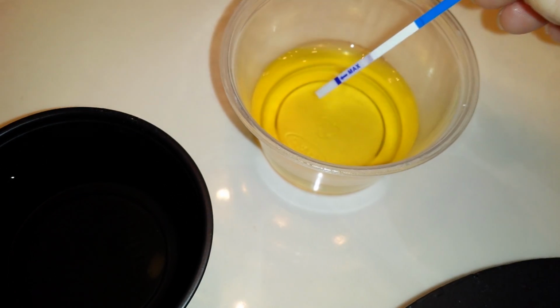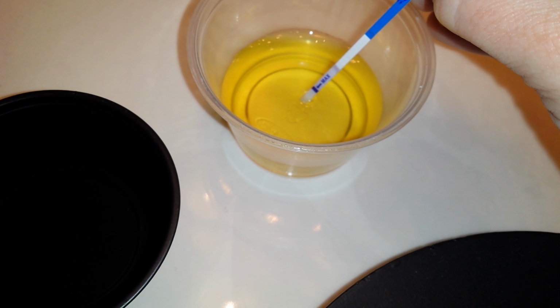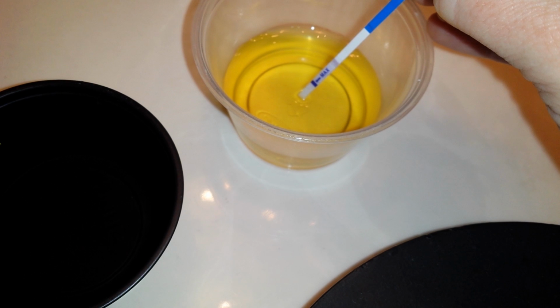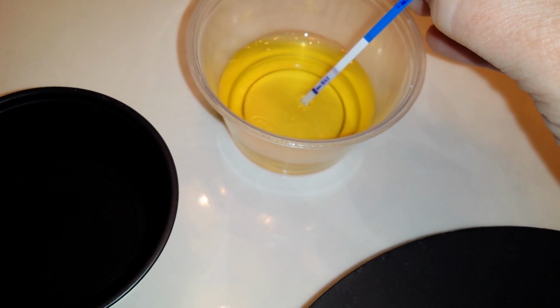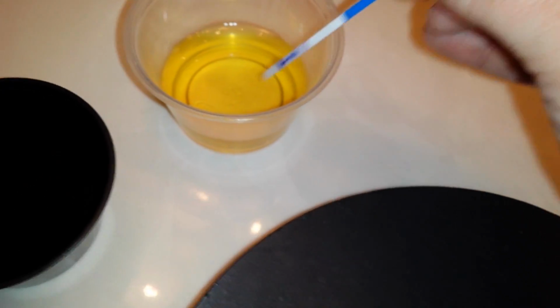And then I'm going to dip the pregnancy test.